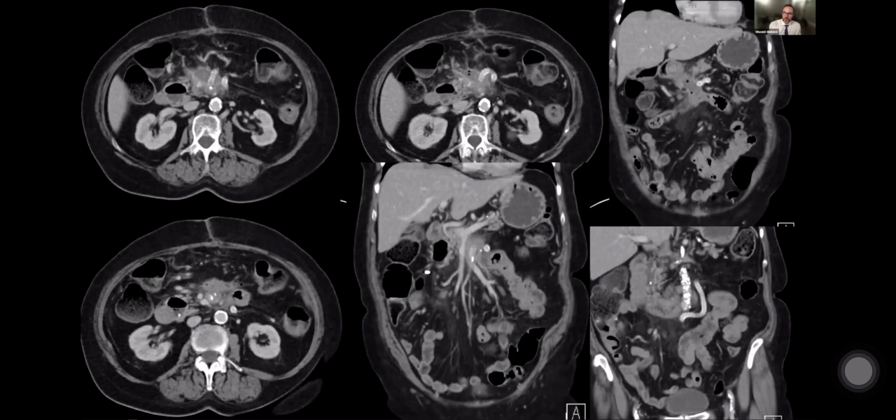So radiation can definitely predispose you to vascular fistulae. And the clinical history again, this patient presented with repeated episodes of bacteremia. They have a graft into their SMA. There's extraluminal fluid and bubbles of gas far removed from the perioperative period. This is an infected graft with a fistula to the bowel.